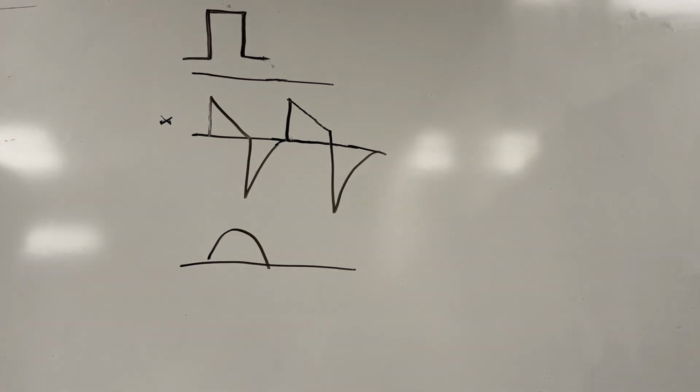So because we're controlling the I time with mandatory breaths, we control how long that inspiratory phase is. And in this case, it's literally meaning that there's not enough time for us to reach zero flow. So our I time is technically too short. For troubleshooting that, there's really a couple things you need to look at. It's not as simple as just going, oh, we're going to stretch the I time out.